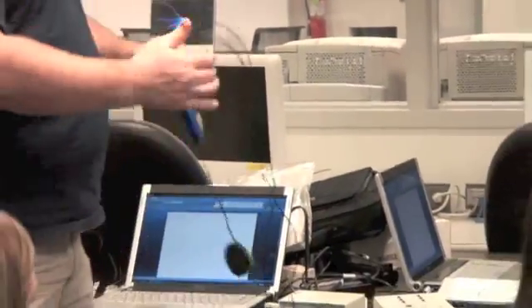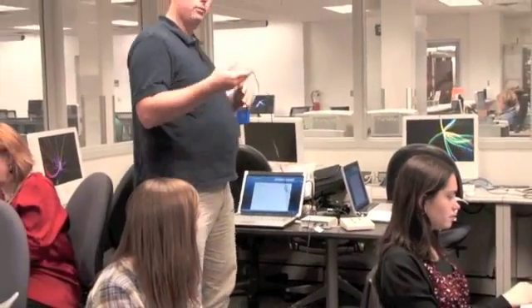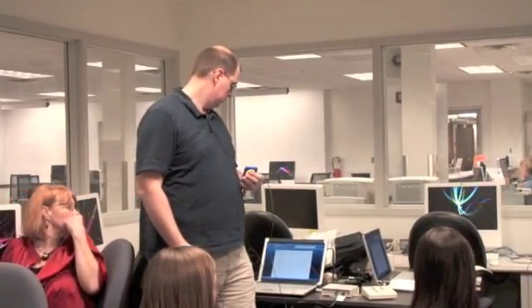The way I've got it set up, with one of my switches I can move my mouse up and down, and with my other switch I move my mouse left or right. So I can navigate my screen completely with just two switches.